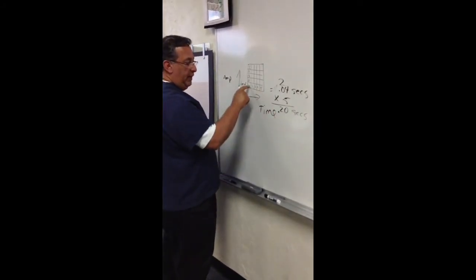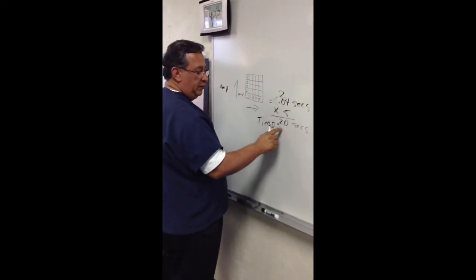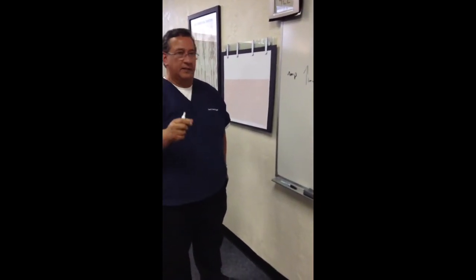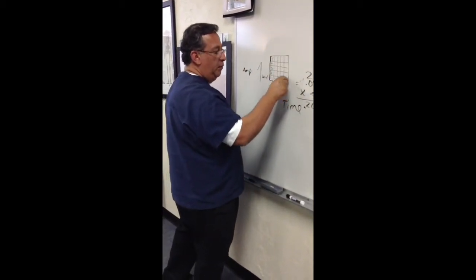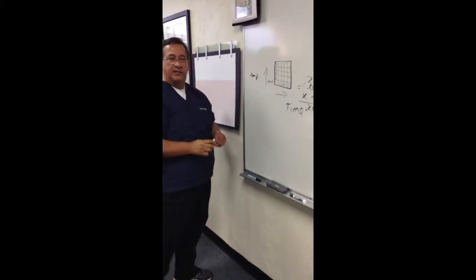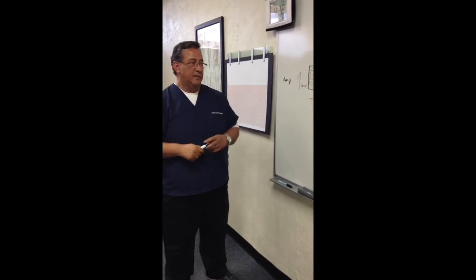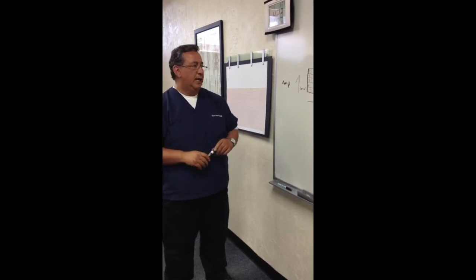All we did was take 0.04 for each little box, multiplied it by 5 little boxes, which is a total of 0.20 seconds, or 2/10ths of a second. That's only 2/10ths of a second, a very small amount of time. So one large box is equal to 0.20 seconds, 2/10ths of a second. But each little box represents 0.04 seconds. It sometimes takes time to get that to solidify in your mind. Please feel free to ask questions. I know that sometimes when you start talking math, people get turned a little sideways, which is understandable. But I need you to understand that basic concept of time.